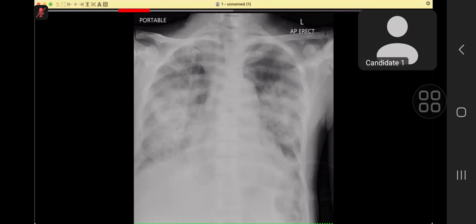So in summary, in this critically sick patient, there is evidence of widespread areas of fluffy airspace shadowing involving almost all of the bilateral lung zones. So I can put differentials in this case. These could be due to alveolar hemorrhage, or this could be pulmonary edema. Other differentials include atypical infections, acute respiratory distress syndrome.